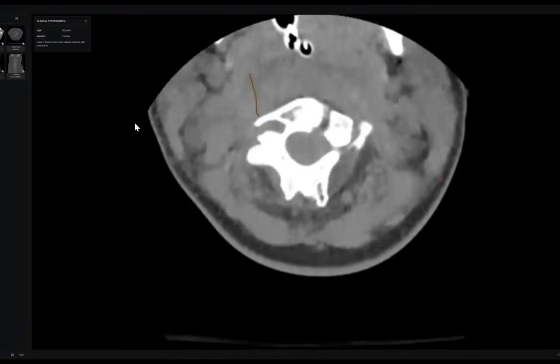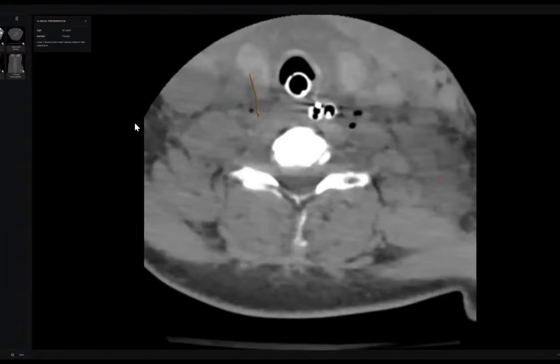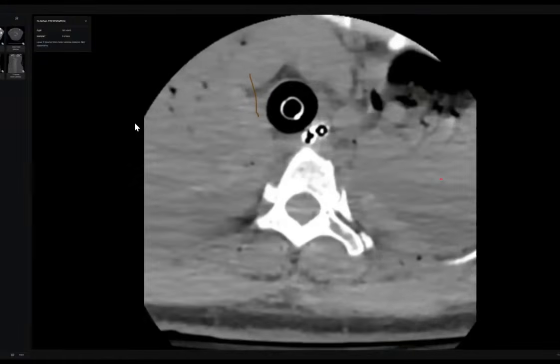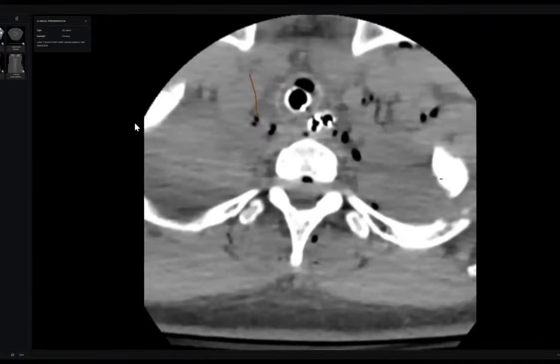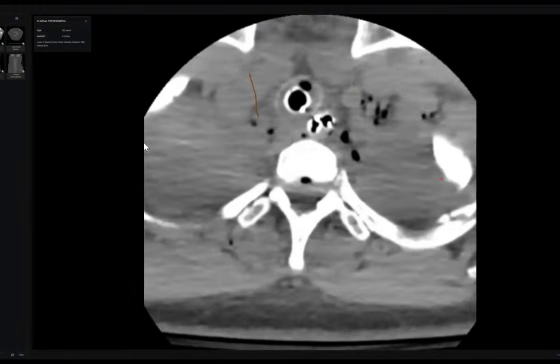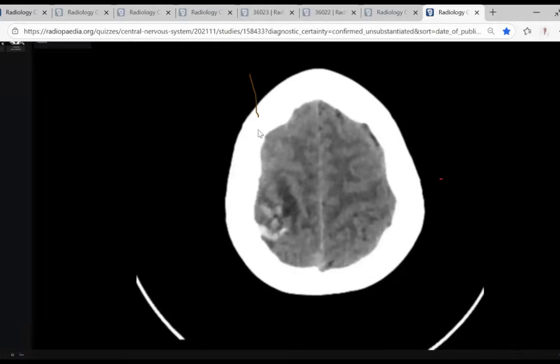So all of these are very important side findings, because some of them may be life-saving. That is all, my colleague. I think the lung is not a healthy lung at all. Look here, the air extended here. So these are very important notes to be covered during any exam. Thank you, doctor, so much. Next candidate.